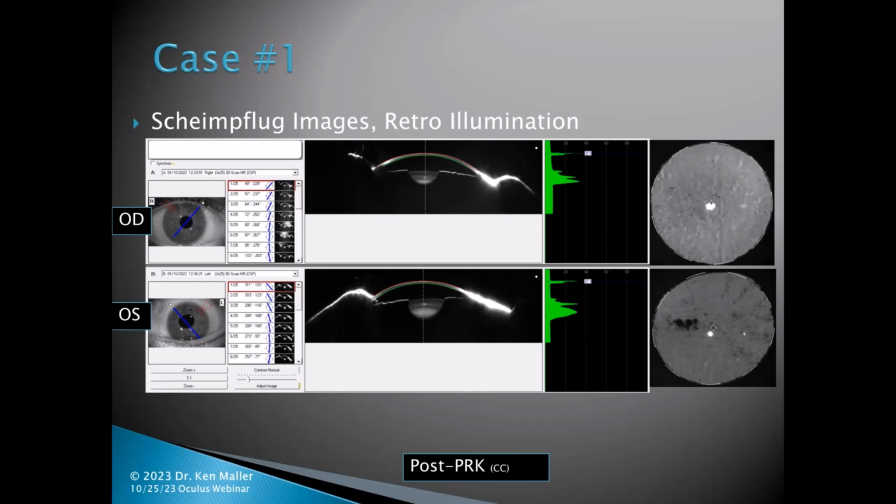And then when we take a look at the left eye, you can see it's even a little bit worse. So the cataract here seems to be a little bit worse on the left eye than the right eye, which does go along with the fact that she was best corrected to 20/200 on the left eye, but I was able to do a little bit better on the right eye, again arguing for the fact that the corneal irregularities are probably not the main player here. These lenticular changes are probably playing a little bit more of a role in diminishing the quality of the vision.